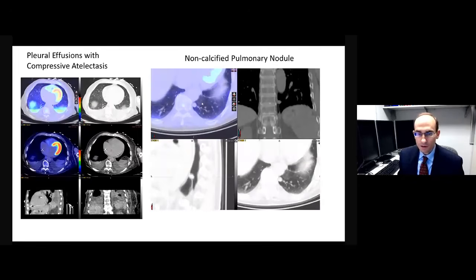And these apply to patients that do not have a history of cancer. They get broken down to: is the nodule solid or is it semi-solid? I'm going to go over mostly solid nodules because the semi-solid ones are really hard to see on the low-dose CTs and it's not very reliable.